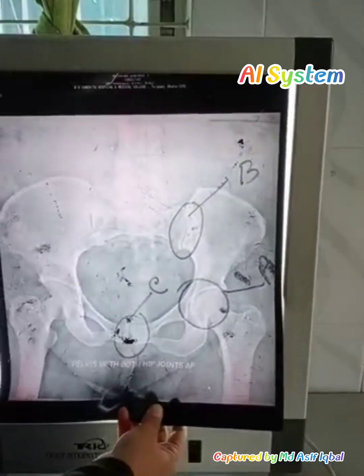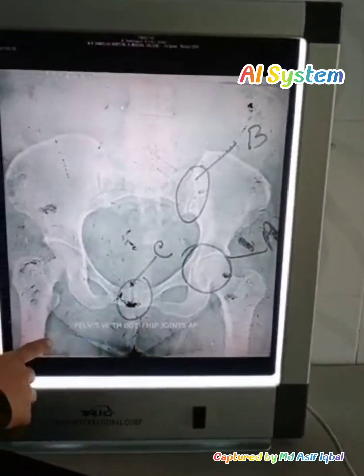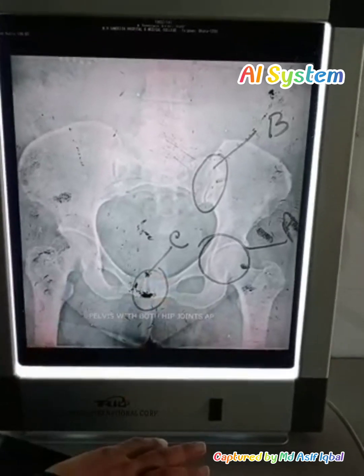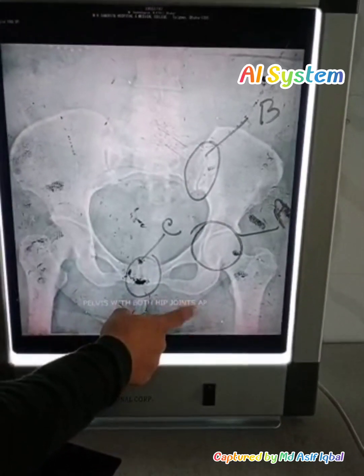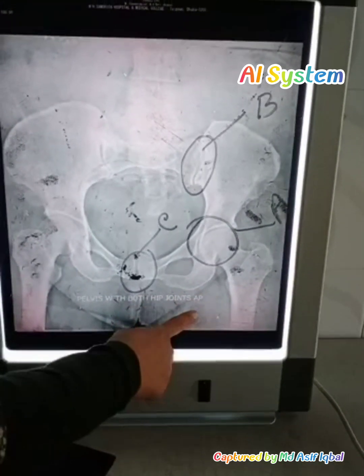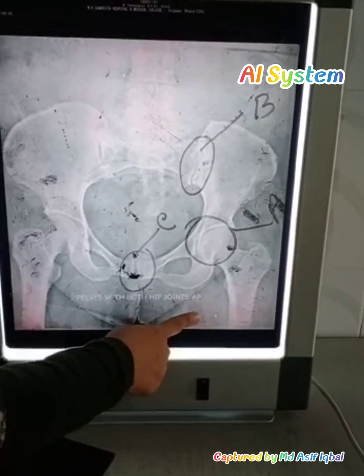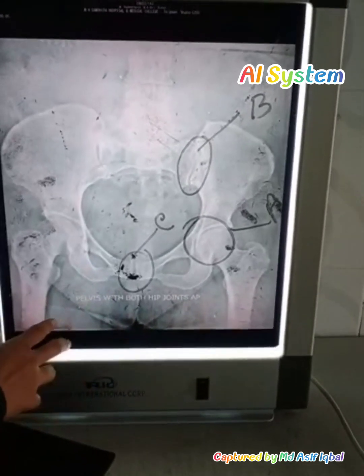এই এক্সরেটা তোমাদের ইনফেরিয়র এক্সট্রিমিটির সময়ও ছিল। এখানে বলবো লেখাই আছে, this is the plain X-ray of pelvis with both hip joints, anterior posterior view. Look at that, there is AP in capital letter, AP already written here, that means anterior posterior view. So what are the structure we can find out in this X-ray?